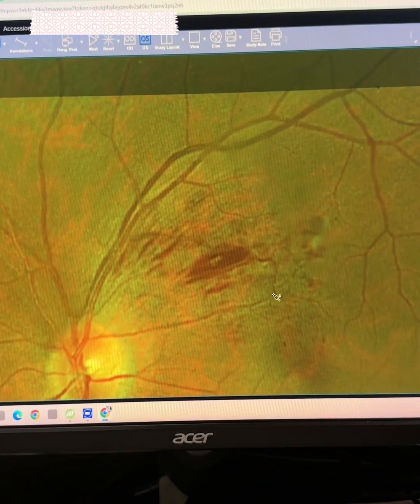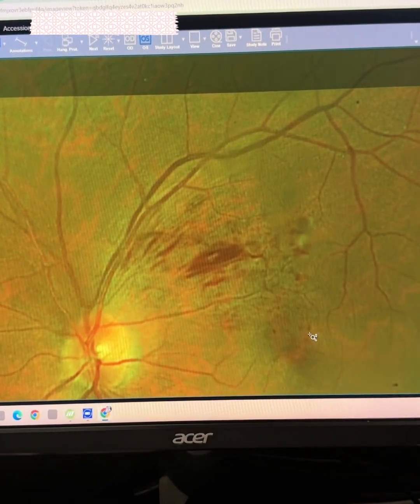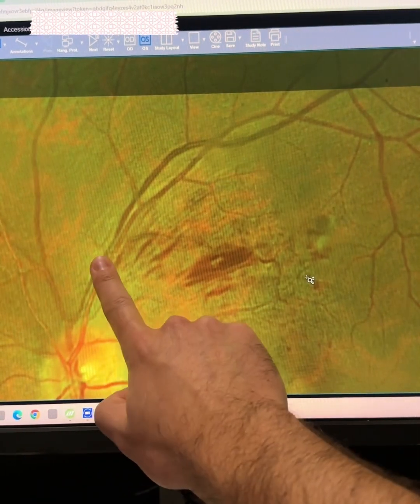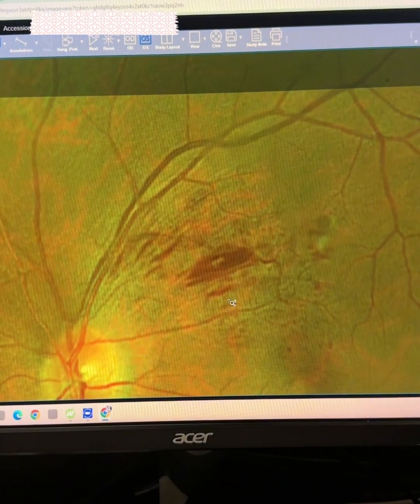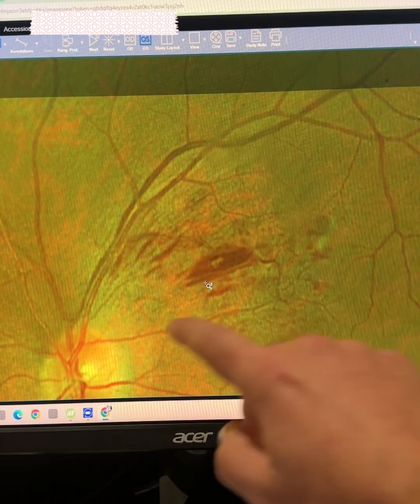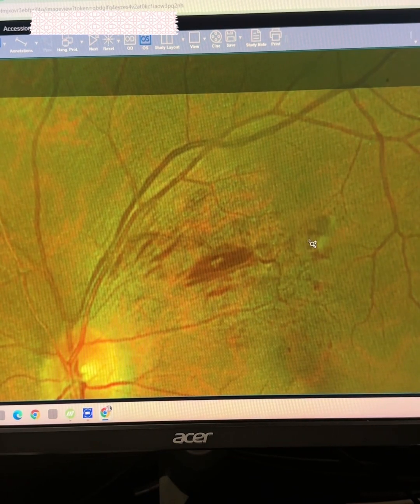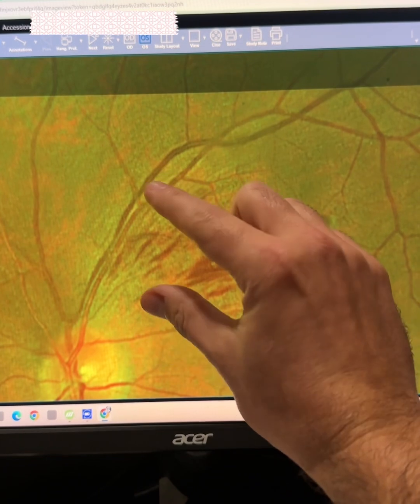So it's just leaking everywhere. And in fact, if you look carefully at the pattern, where's the blockage? Just based on the pattern, you can tell where the blockage is. The blockage should be here. Now, if you look more specifically, you look at an artery, because you know this is a side effect of high blood pressure. Over years and years and years, the arteries are getting stiffer. It's called atherosclerosis.